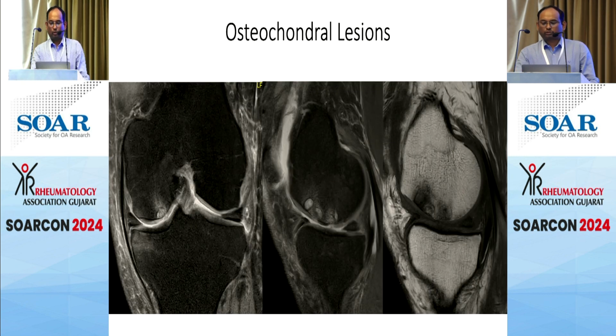When we come to the osteochondral complex lesions, there will be cartilage as well as the subchondral bone, that is the bone just beneath the cartilage. There you can get some marrow edema, which is seen as bright on fat suppressed images. There can be a cyst, which we generally call a geode. We need to differentiate between cysts versus erosions, but when there is a combination of disease processes going on, it sometimes becomes difficult.